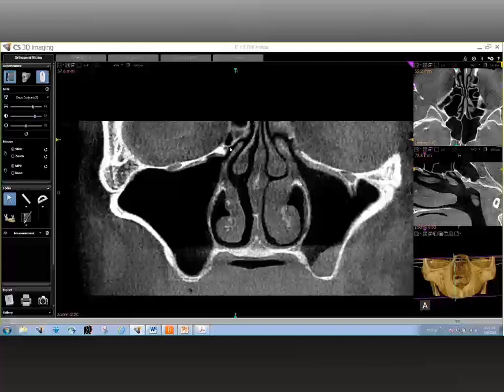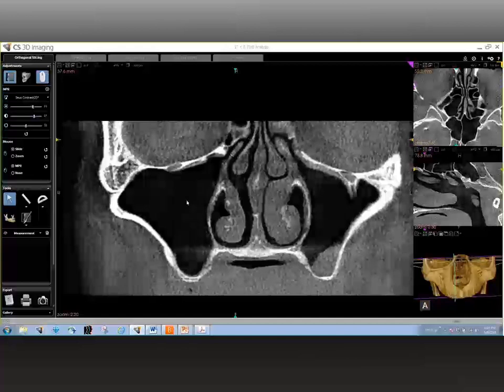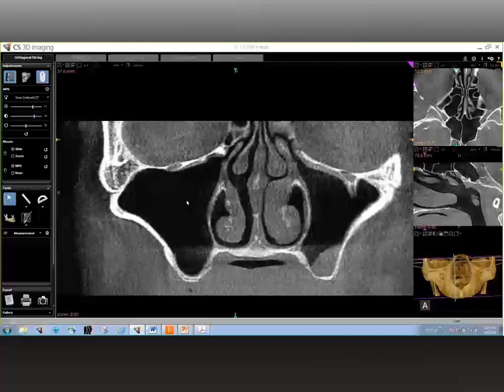So by having the ostium open, what that implies is that you have a fairly healthy sinus. Now keep in mind, the sinuses are not sterile areas. But when you have the ostium open, it shows that the sinus is fairly healthy. And if the ostium is blocked, it is a sign of chronic sinus disease of any nature. It could be of varied nature. I mean, there's no one thing to it, but you have to further examine the patient for any other chronic diseases, or acute even. Okay, so what does one do if occult pathology is noted within the sinuses?